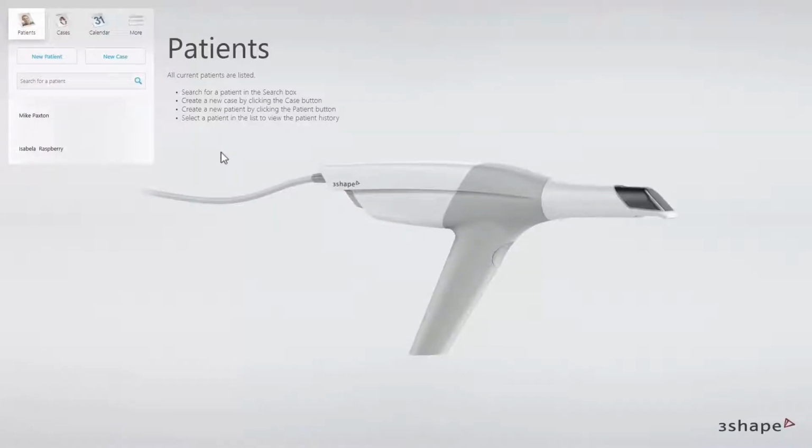In this video, you will learn the TRIOS Design Studio Veneer workflow. The TRIOS Design Studio solution is a complete digital workflow with fully integrated CAD/CAM modules. This solution is dedicated to dental practices that would like to produce restorations like crowns, inlay-onlays, veneers, and bridges in-house.